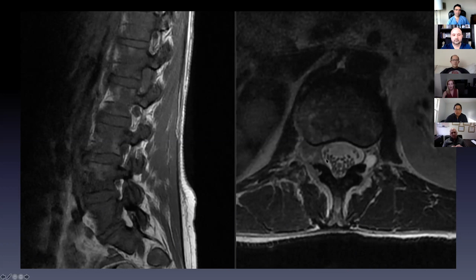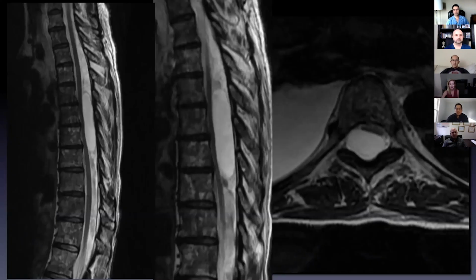Here's an axial T2 weighted image. You can see there's abnormal soft tissue intensity in this foramen. Like you guys, when you pull out a big juicy disc or a big tumor, it's very satisfying. When we have something where we say, okay, this finding exactly goes along with the person's symptoms, it's very satisfying. So I was very excited that I found her pain. But then I had to read the rest of the spine. So I went to the thoracic spine, and this is what I found there.